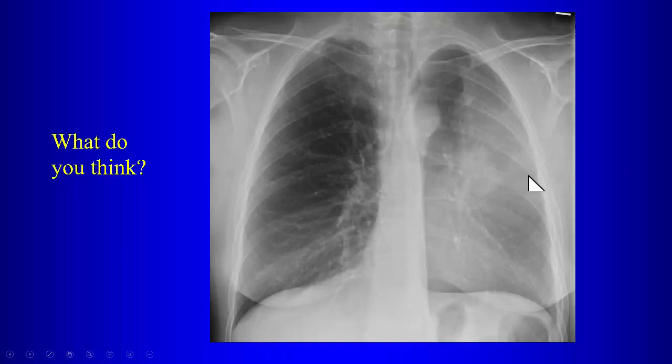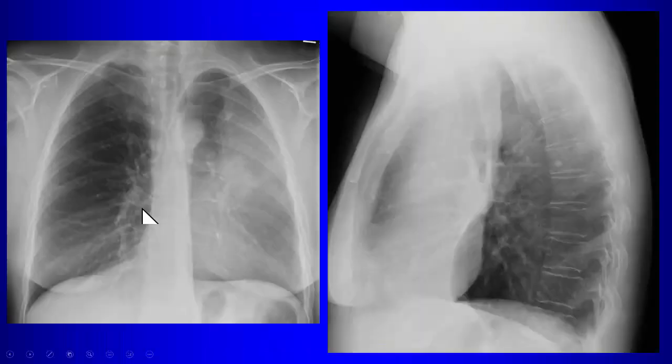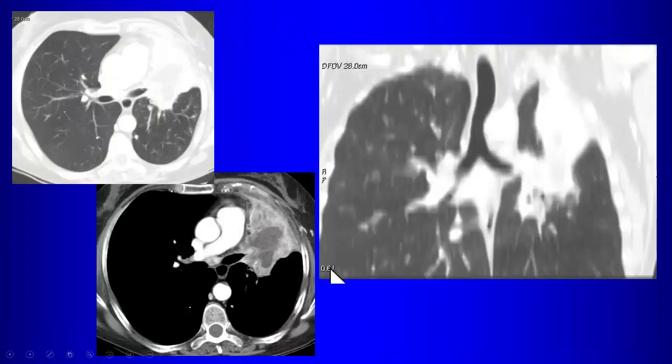The best radiographic view for demonstrating left upper lobe collapse is what? Lateral view. So notice on the frontal view, left upper lobe collapse is pretty sneaky, right? It's not always easy to tell what's going on. But on the lateral view, what do we have here? What is that? Yeah, that's the major fissure that's displaced anteriorly, and then all the opacity anterior to that represents the collapsed left upper lobe. So the lateral view is the best radiographic view to actually demonstrate left upper lobe collapse.